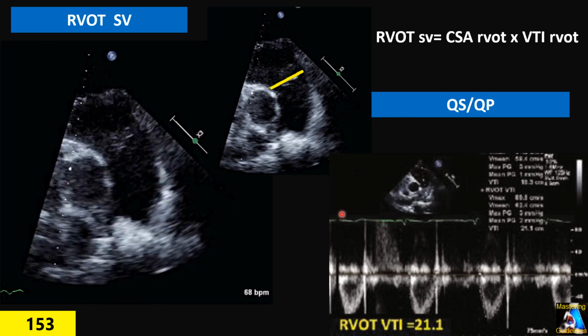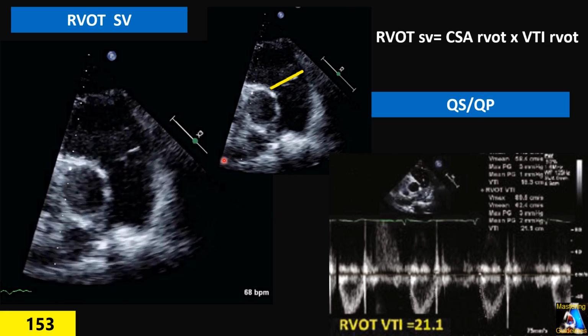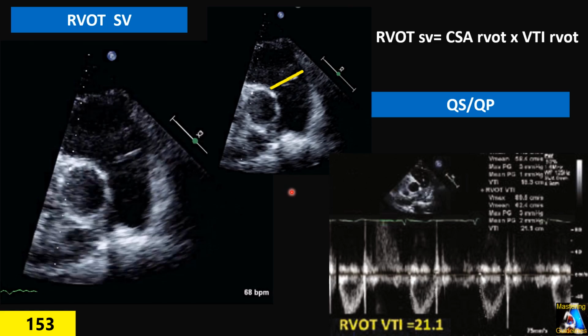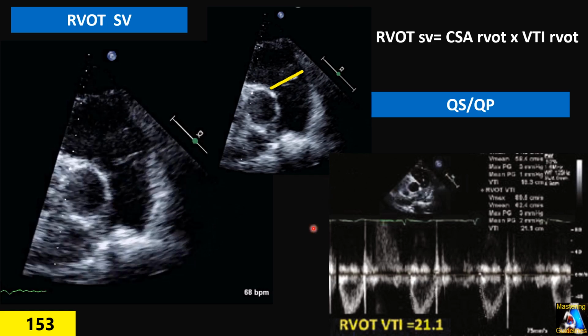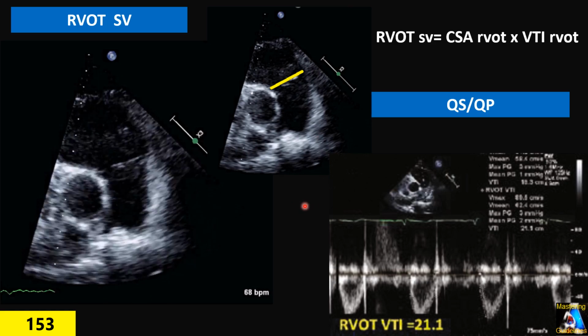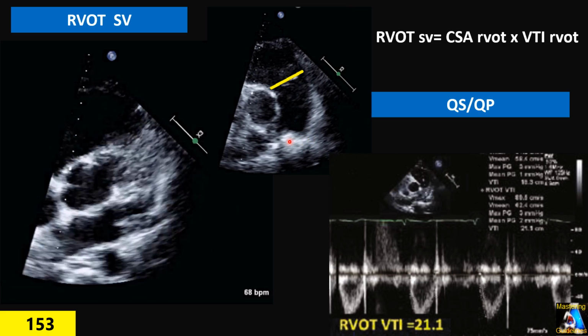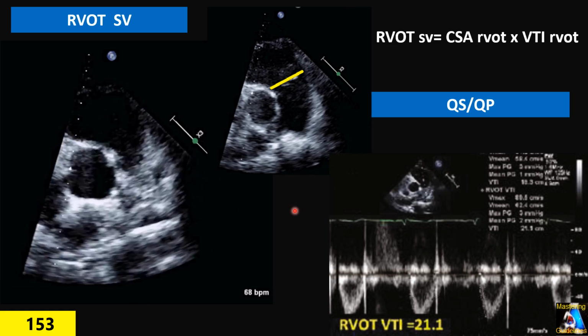To become more professional and accurate in these stroke volume measurements, I strongly recommend that all of you, when you have a good patient with no abnormality, or only trace mitral, tricuspid, pulmonary or aortic regurgitation, or if the patient has none of them, which is much better, practice all three measurements and see how close you are. All those numbers should be almost the same. A 5% difference between them is acceptable because of beat to beat differences. In that case you know exactly where your mistake is, and you can fix it until you become proficient in measuring the stroke volume at each of those spots.